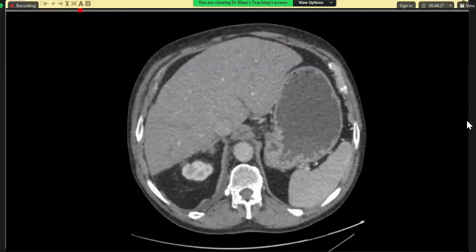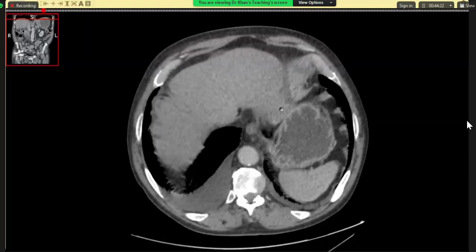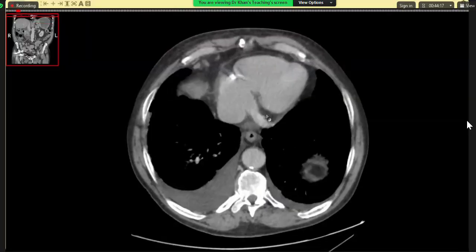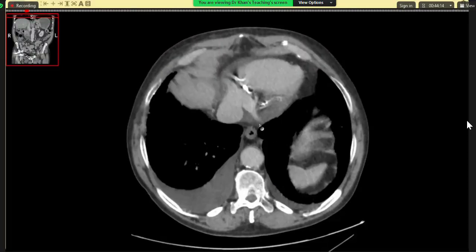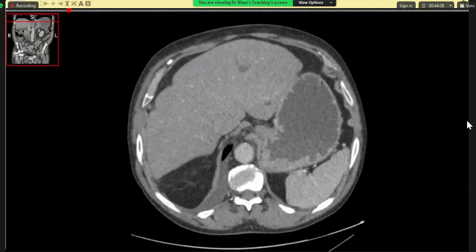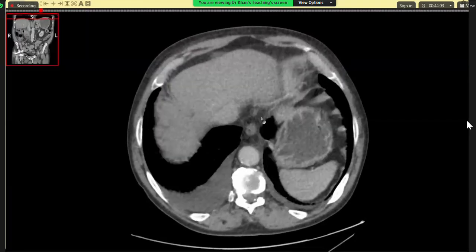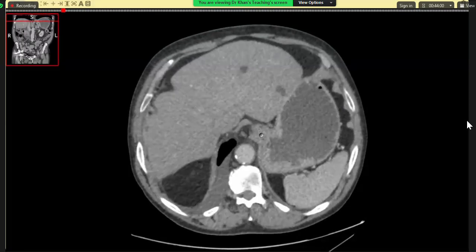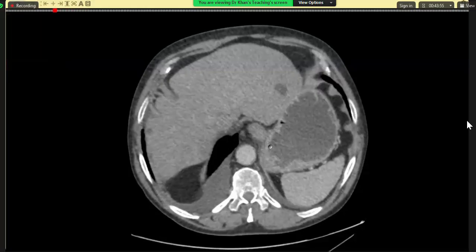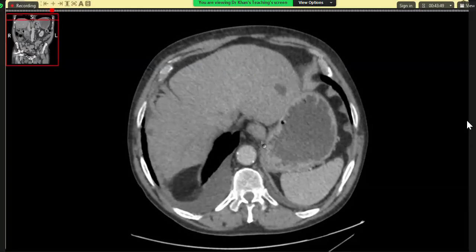Okay, these are contrast-enhanced CT axial sections in the portal venous phase of a 65-year-old male patient having history of, I think, acute abdominal pain, you said. I am scrolling from the top. I can appreciate that there are bilateral pleural effusions more on right side, and also in the liver there are few low density lesions, especially in the left lobe of the liver. I'm going down. I can appreciate that there is a mild thickening of the stomach in the region of the gastroesophageal junction.